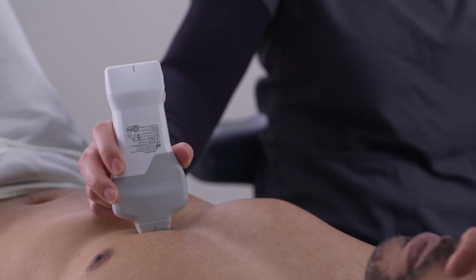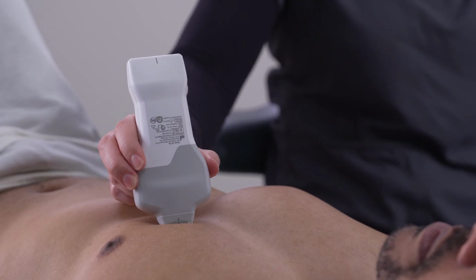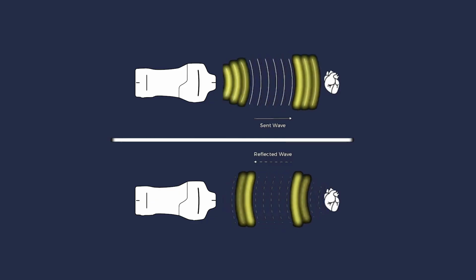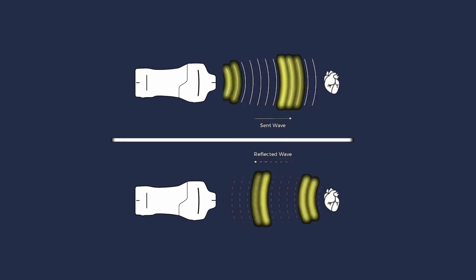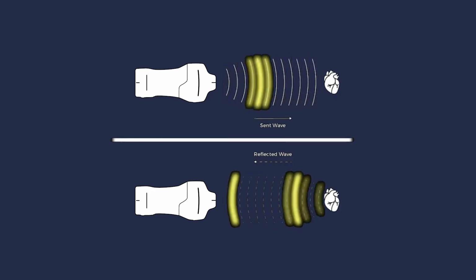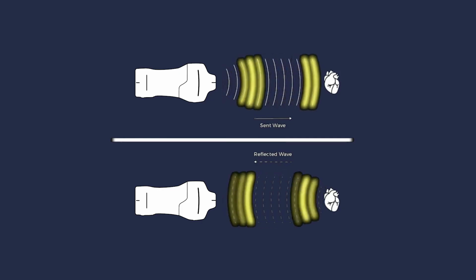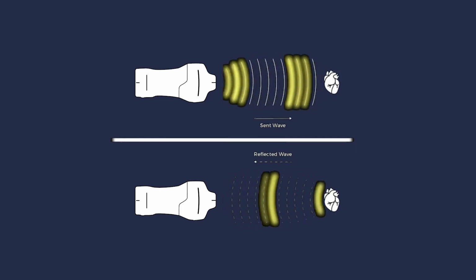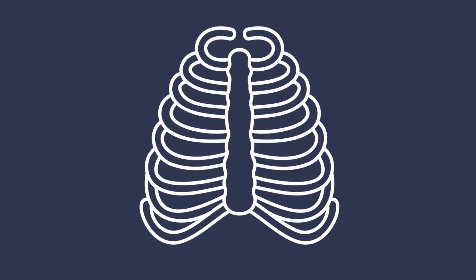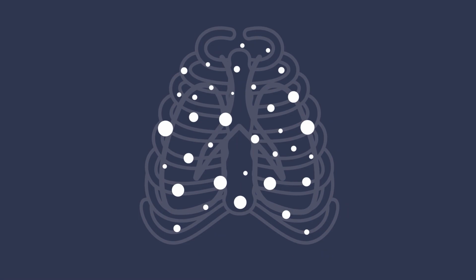Ultrasound is an imaging technique used to image structures inside the body using high-frequency sound waves. To do this, we use ultrasound probes, also known as transducers, that send and receive high-frequency sound waves into the body that bounce off anatomical structures. When the probe receives the sound waves back, the ultrasound software processes them and generates an image. Ultrasound does not travel well through bone or air.